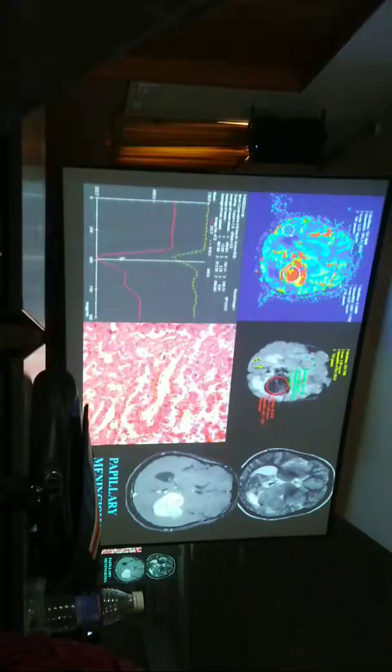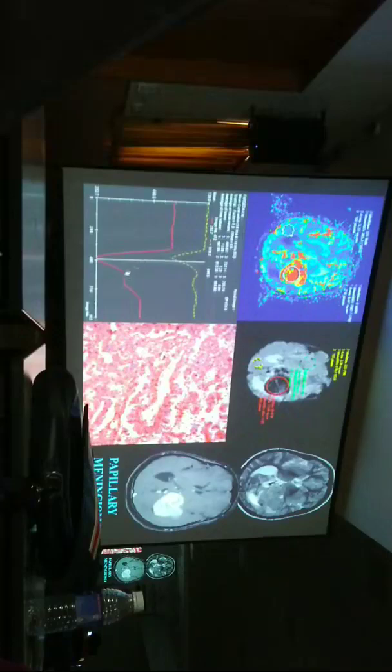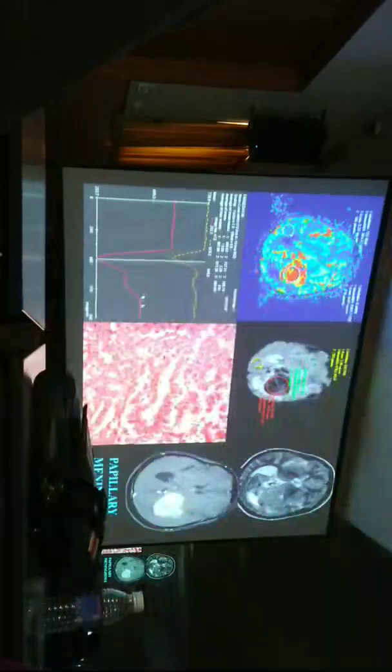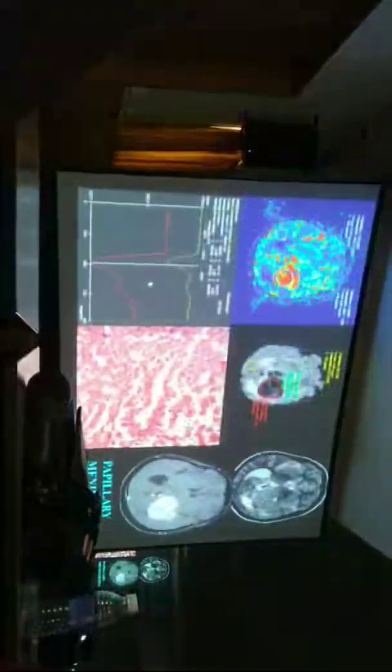And one other thing we see is that this is not reaching the baseline. Of the post contrast, whatever is not reaching is leaking through the venous. There is a lot of arteriovenous shunting there. That is why it is not reaching the baseline. One of the tumors that we have is the meningioma, which shows a lot of that. So this turned out to be a meningioma.